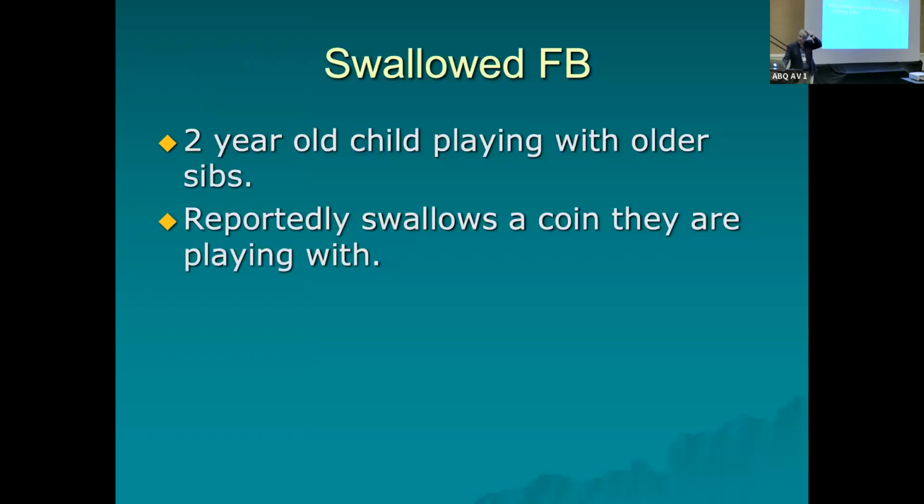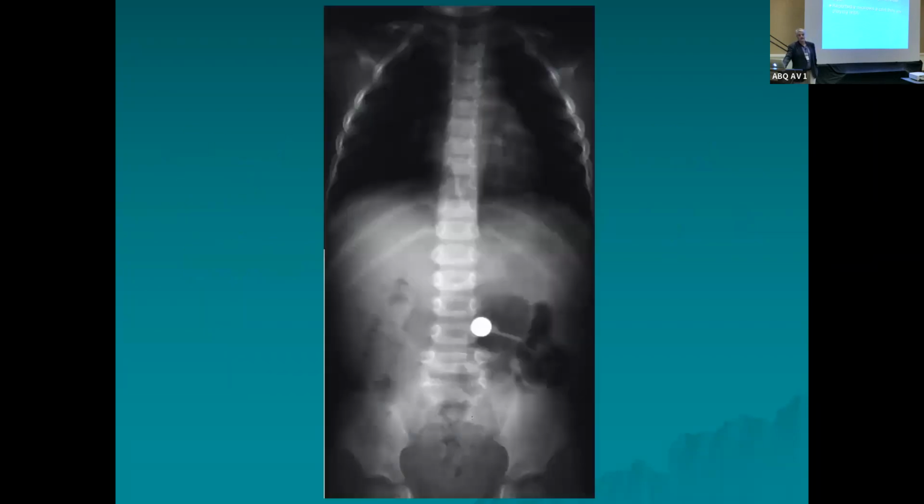My final one right here: a 2-year-old child playing with older siblings reportedly swallows a coin that they are playing with. Well, they get an x-ray, and when somebody comes in to my office and says that they swallowed something, I think, oh my goodness, please don't be in the lungs. Well, you can look right here, and I'm relieved that it's not in the lungs, because if it was, all it's got to do is turn like that, and I'm blocking off an airway. So I think, whew, it's not in the lungs.